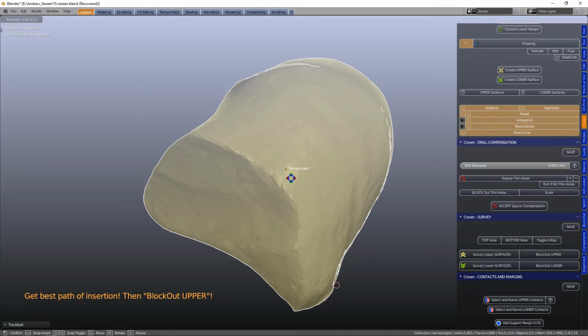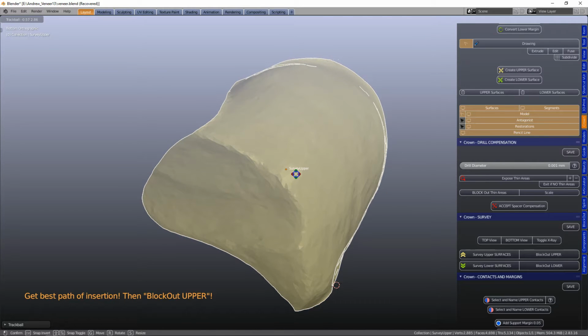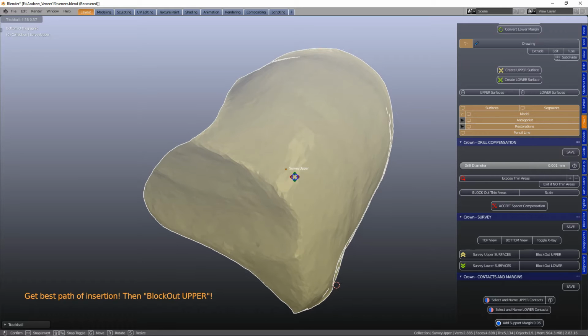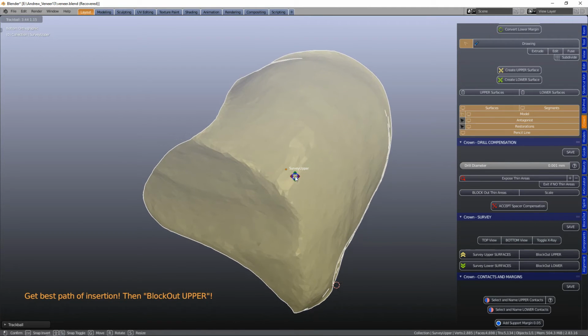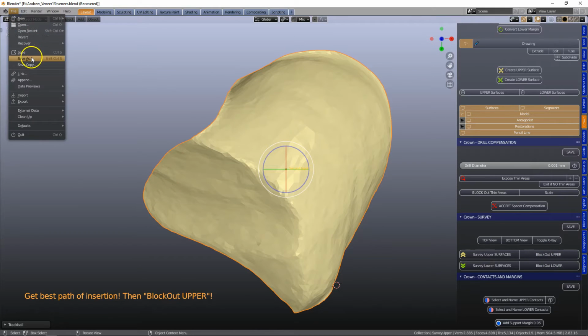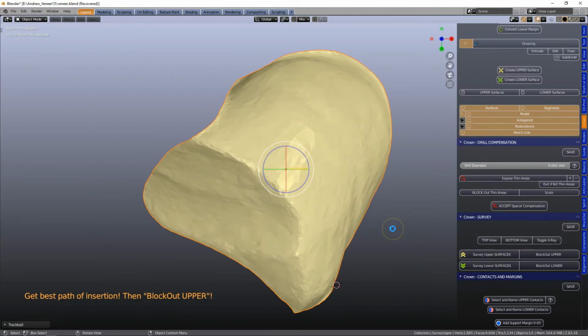It's a little bit of a silhouette, and we can see a double edge up top in the left corner there. The mesial edge there is sort of a little bit undercut as I'm moving it, and the bottom distal. So I'm going to have to reach a compromise, and then we're going to block this out. And while I'm doing this, I keep on saving my files just in case I need to revert back to a certain procedure.